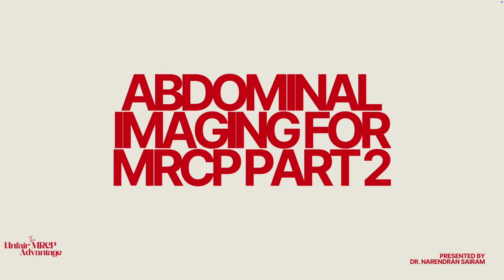Okay, so today we're going to be talking about abdominal imaging for MRCP part 2. Let's get started. There are about 30 to 35 images that you should be familiar with. There are, of course, more images that could potentially come for the exam, but it's important to understand that these are the most commonly asked ones.